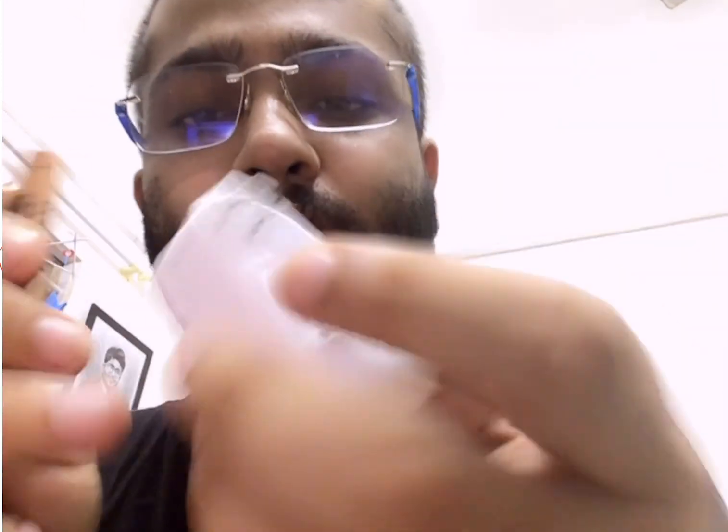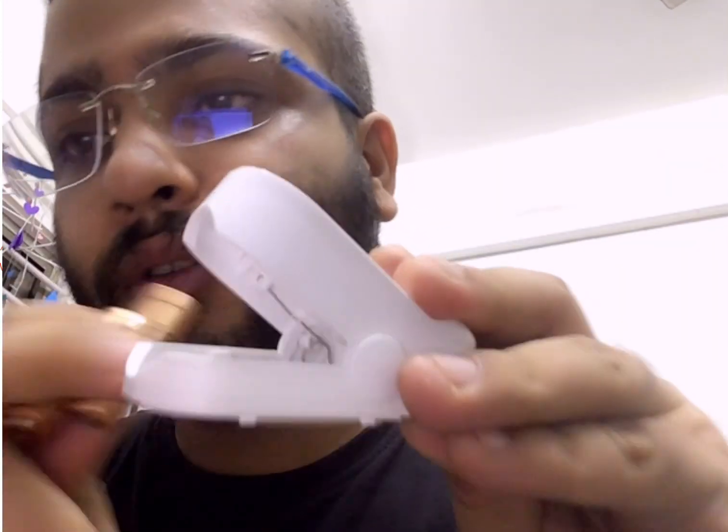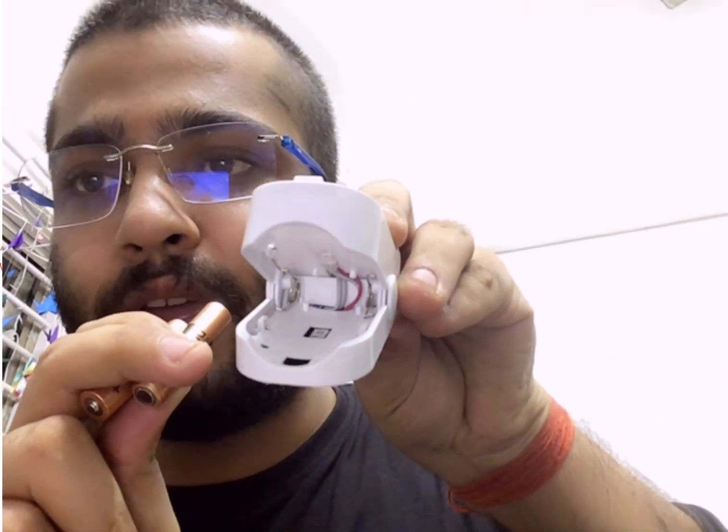calculating the transmitted red light to the transmitted infrared light. And if I show you the simple connections, it has two batteries basically, and simple connections are there. You can see connections going there, and also connections inside. Okay, so this is basically the simple structure. Only two LEDs, infrared and red, then one detector and one processor. So it is a very simple device but a very useful device.